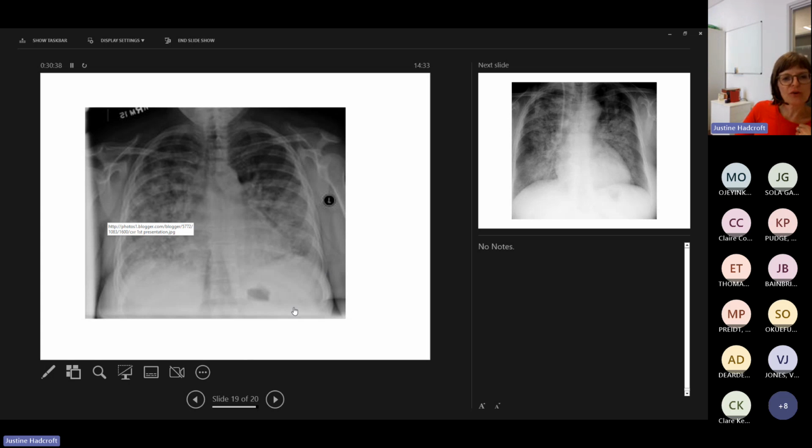I think this was COVID pneumonia. So this is what COVID pneumonia looked like when we used to see a lot of proper rip-roaring COVID pneumonia. This is the kind of bilateral, widespread, fluffy, patchy consolidation. Pulmonary edema can look like that as well. Pulmonary edema is said to show bat's winging, so it usually spares the peripheries and occupies a triangle in the middle of the lungs, not the middle lobes, but the middle of the lungs there.